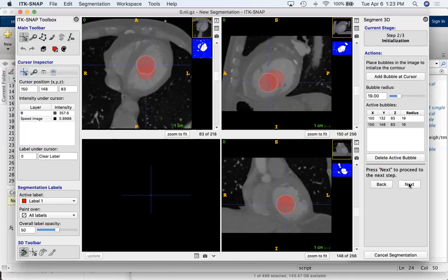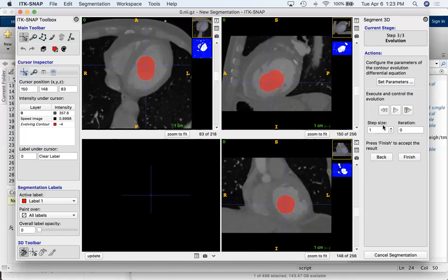And now it gives you step size, tells you how many steps it's done, and it will just segment until you're happy and finished with it. So if we press this button, we can go in step size of unit 1, right? But if you go down here and say 25, it's probably smarter, and then it grows.